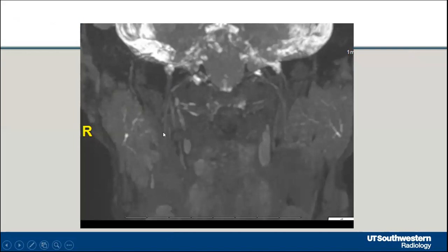So this is the nerve which is going down, the hypoglossal nerve coming from here. So you can see all these nerves. Actually, sorry, let me repeat again. The larger one is the vagus nerve. The medial-most nerve is the 12th nerve, which comes like that. And then the spinal accessory, you'll see it going like that. So you can find all these nerves.